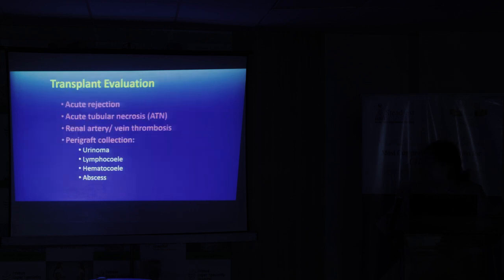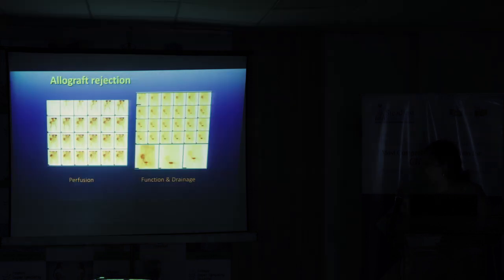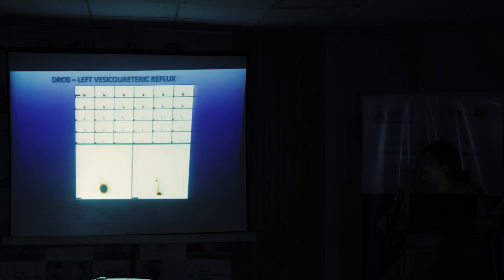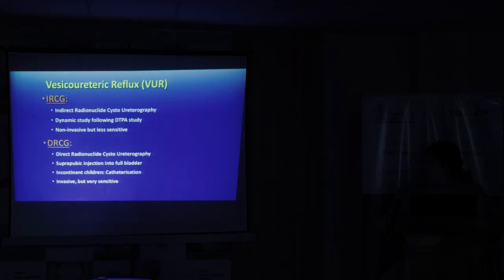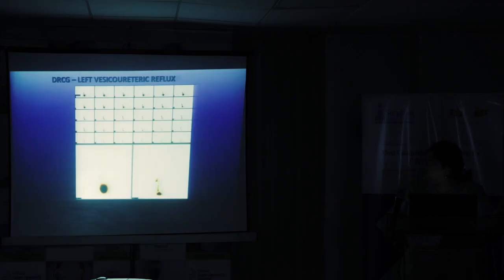We have some transplant evaluation, you want to go through all this, I can go through. But if you just want to go through the images, you can quickly go through the images. So these are, basically you also do reflux studies.